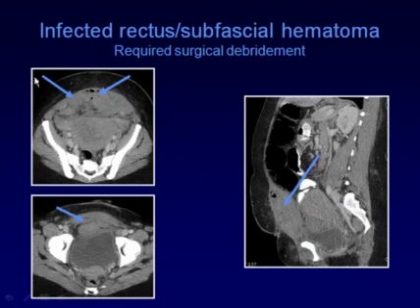This patient has infected rectus muscle hematomas extending into the subfascial region. You can see the bubbles of gas and very good-sized hematomas in this area. Here in the sagittal reformat is the uterus, the bladder, a slightly larger than normal bladder flap hematoma, but a much larger hematoma in the rectus muscle containing some gas.